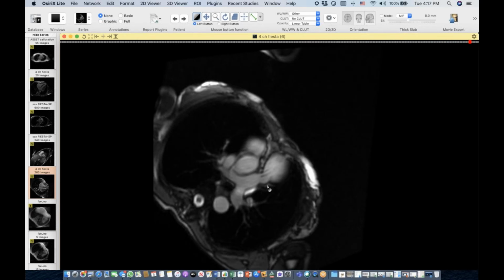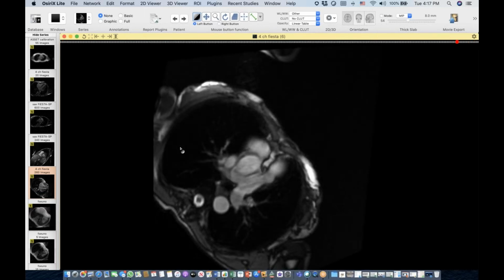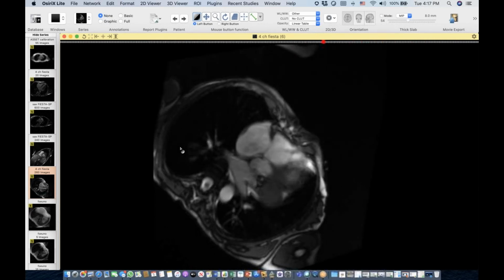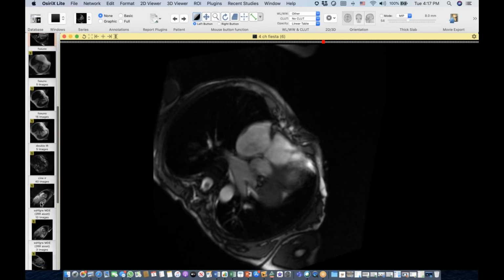This is where the pulmonic valve is, and there's also a jet of insufficiency. So there seems to be some component of pulmonary valve insufficiency as well, not just tricuspid. So we have a couple of masses here in the heart, but just as important, we have right-sided valve disease. So I think those are good clues. While you guys think about it, let's look at the enhanced images.